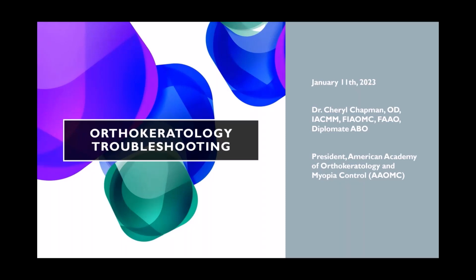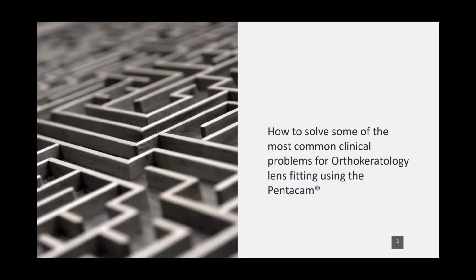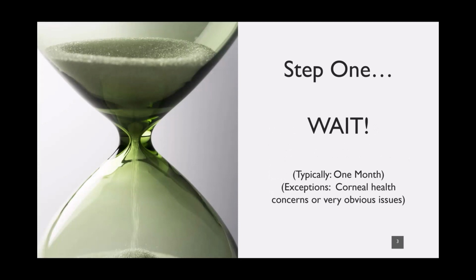So hopefully tonight we will be able to demystify some of the common pitfalls that you might run into with Ortho-K. A lot of what you're going to see tonight will be based off of Pentacam scans, but you'll see some MedMont topographies as well. I'll try and walk you through things so that you can orient yourself with what you're looking at.